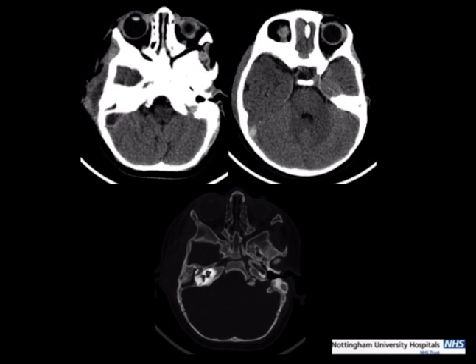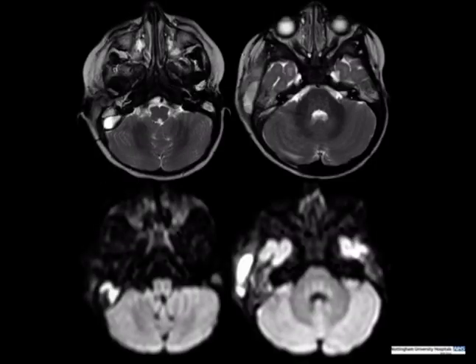When we look on the MR, you can see this is a really T2 hyperintense collection inside the head. It's extending outside the sigmoid groove, and that's important because although it's definitely showing you diffusion restriction consistent with an abscess or an infected collection, sometimes thrombus in that location can give you abnormal diffusion signal as well, depending on the stage of it.